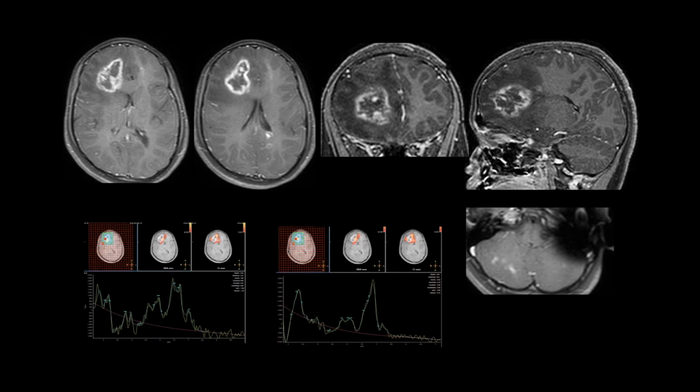You mean something like lymphoma and leukemia, things like that? Yeah, histiocytosis. Which of those would calcify, unless we're dealing with two pathologies? Not for the calcifications. Even the cerebellar lesions are also showing enhancement. They're also probably acute. There is a calcification even inside these lesions.